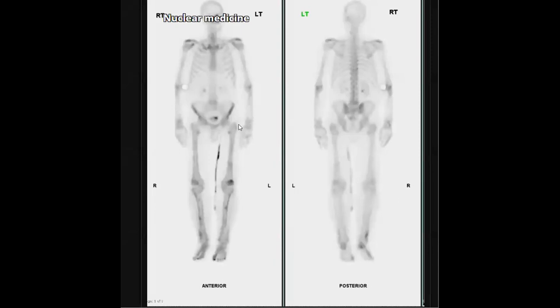And it is in the cortices, in the cortical bone. So in such case, as you mentioned, you are worried about hypertrophic pulmonary osteoarthropathy as a differential. There is also another differential like venous insufficiency. Maybe someone asked, what is this? Anyone know what this could be?